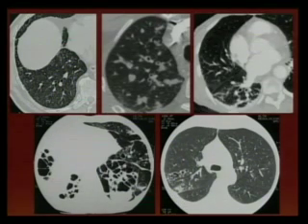We can see branching opacity because there is an occupation of the bronchiectasis by secretion, so we have mucus plugs, we have thickening of the wall, we can see cystic changes in the lung bases in cases of cystic bronchiectasis, or you can see bronchiolectasis, that is the dilatation in the very subpleural area, where normally the bronchi are not seen. So when you are seeing bronchi or airways in the peripheral portion of the lungs, that is totally abnormal.